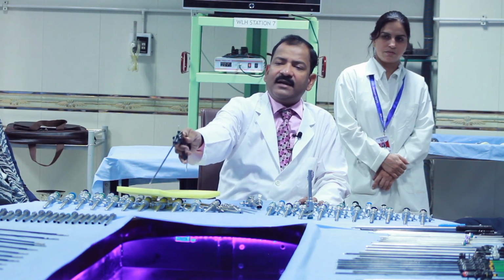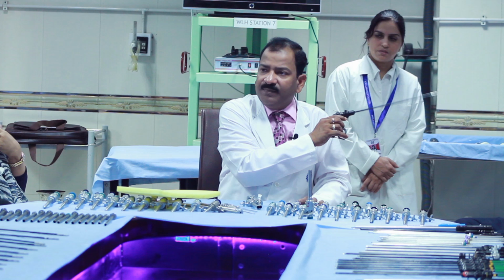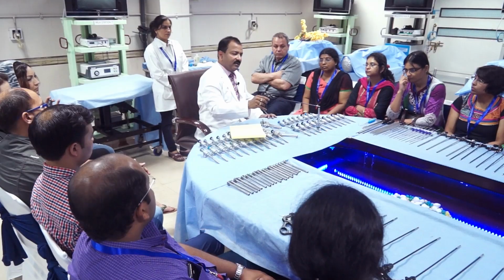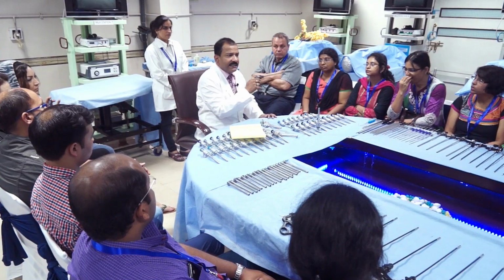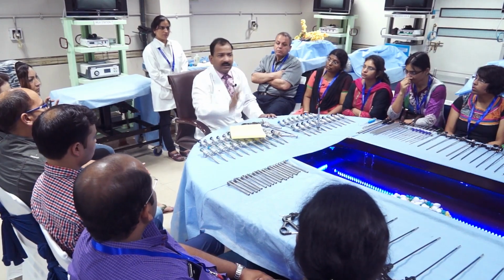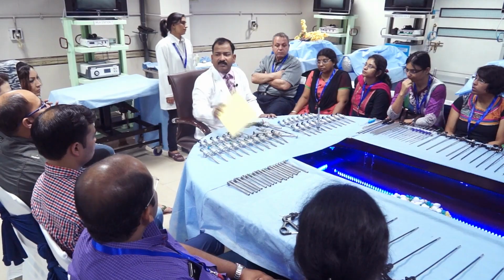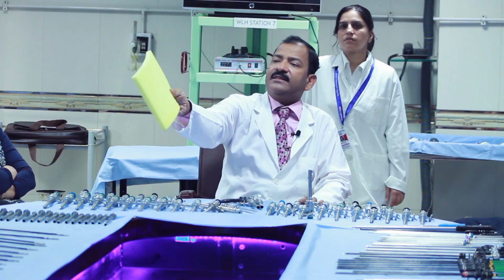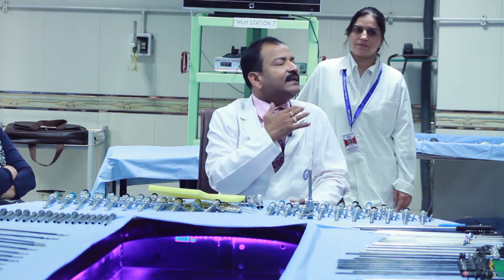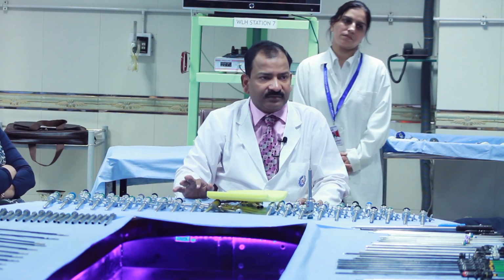Then you should stand near the opposite shoulder, and the monitor should be kept near the hip on the right side. So if the eye of the surgeon, the target of dissection and the center of the monitor are in the same axis, this is called coaxial alignment. If you have coaxial alignment, then your performance is correct. Suppose you do not have coaxial alignment, suppose you keep the monitor here and you are standing there, then you have to bend, and as soon as there is more than 15 degrees of head tilt, your performance is deteriorated by more than 25%.